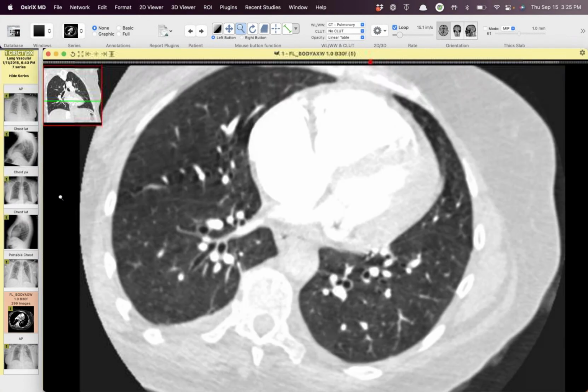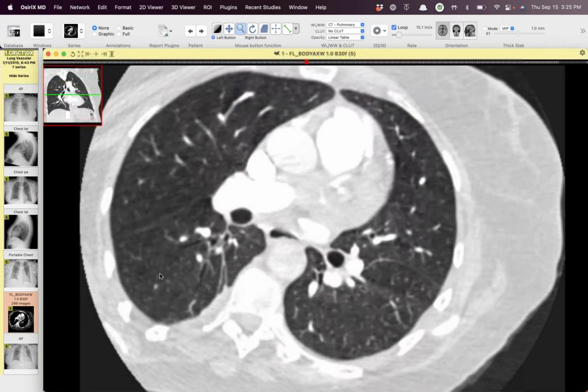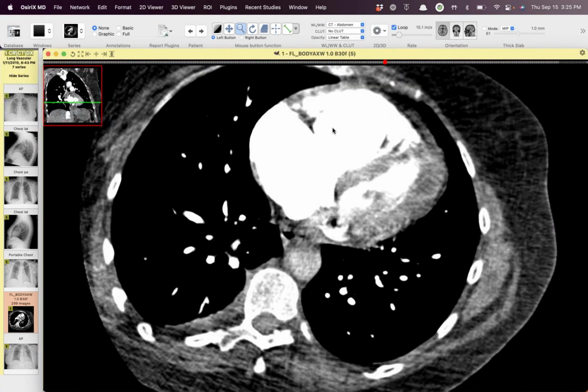The effects of injecting drugs. Yep. And she had a couple of indwelling catheters. And yeah, so it was excipient lung. I don't see anything here in the lungs, but it makes the most sense for an acute right heart failure like this.